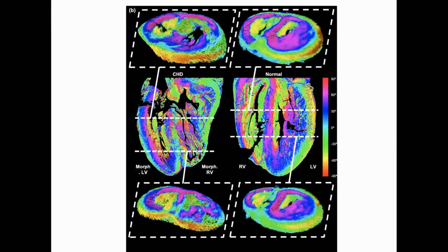And this, for example, is a heart from a fetus that had severe congenital heart disease, so severe abnormality in development of the heart. This was a fetus that, instead of a left and a right atrium, had two right atria morphologically, also had the left and the right ventricle switched, had a big hole between the two ventricles, and also the mitral valve and the tricuspid valve were fused. So it's a very, very severe abnormality. That's also why the fetus died in utero.